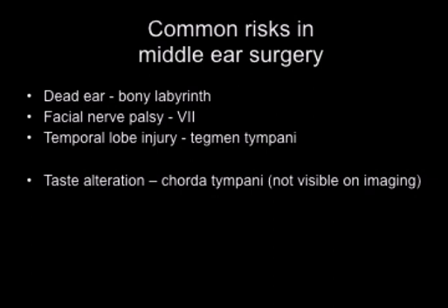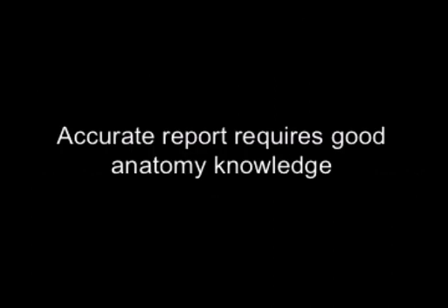We cannot see it, so I've mentioned it, but it's not something that you're going to report on your CT temporal bones. And the patients often have taste alteration from that. So the next sort of 9 minutes, I think it is all about anatomy.